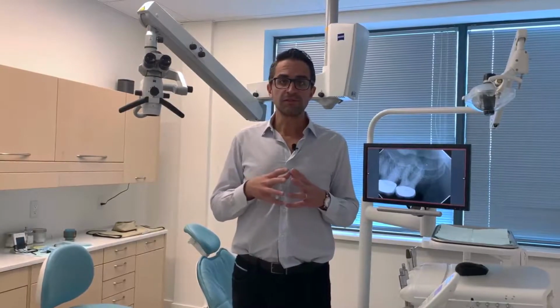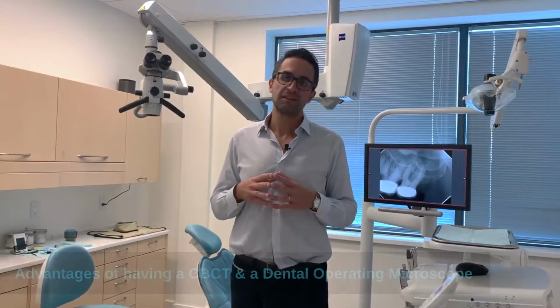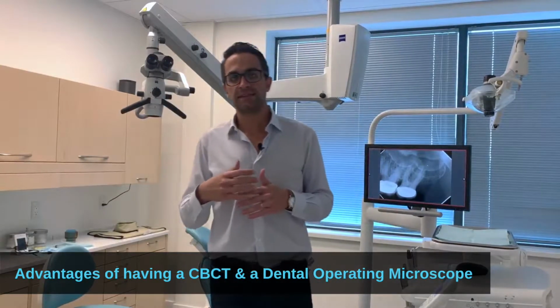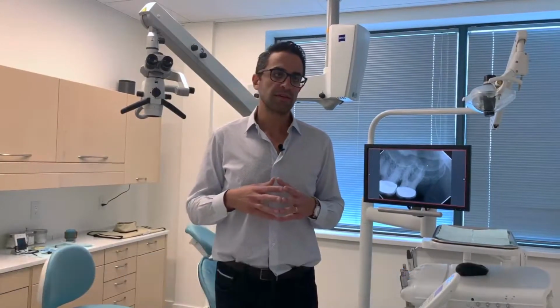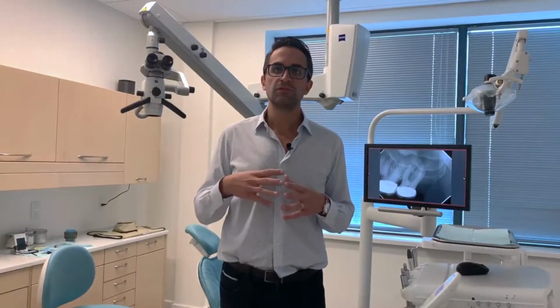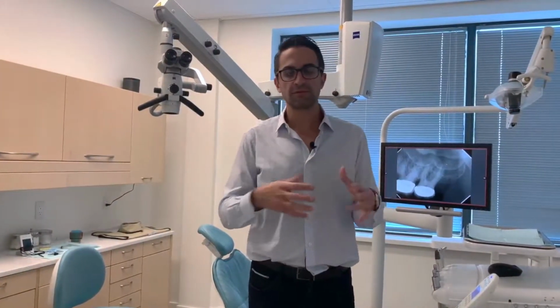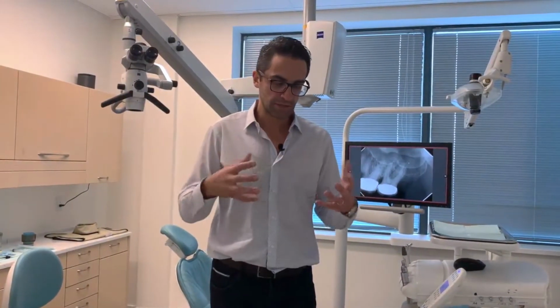Today I want to discuss with you a case that shows the advantages of using a CBCT and a dental operating microscope in endodontics in order to really treatment plan, diagnose, and really be able to help the patient with whatever he or she is experiencing.